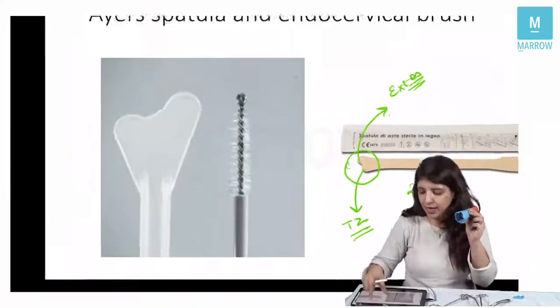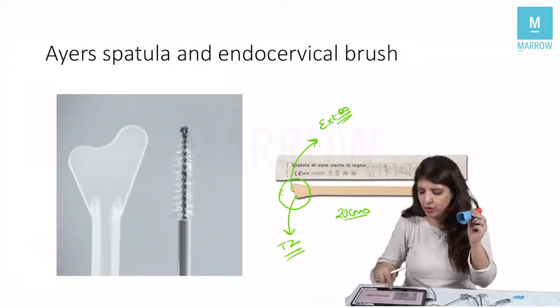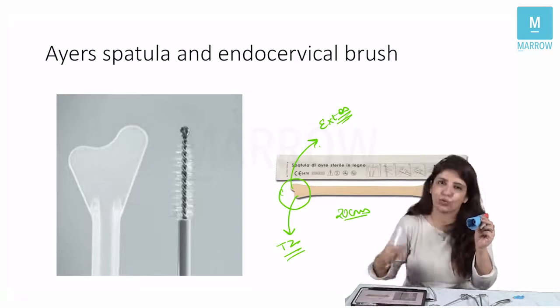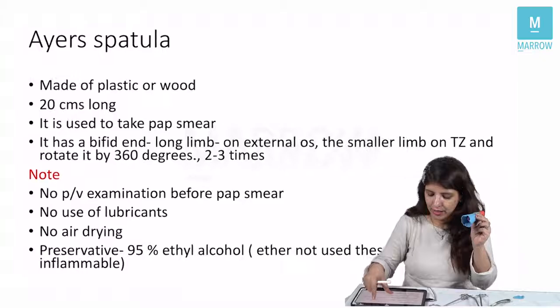Then the other thing which you have to remember, endocervical brush, you know that it is used to take the pap smear from the endocervical area.